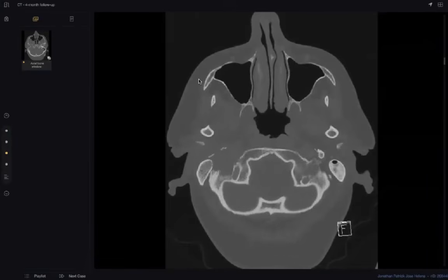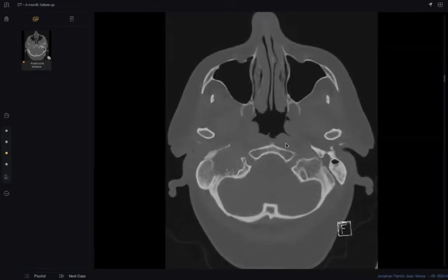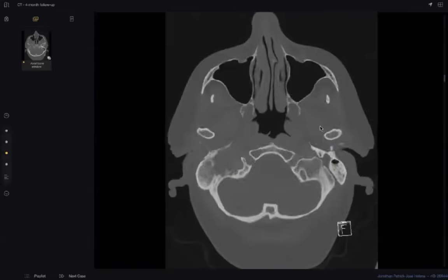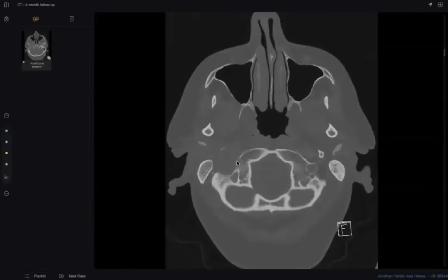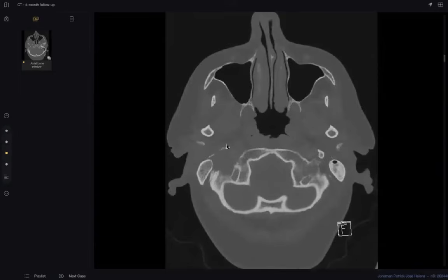And what is this? What is the name of this structure? This is the jugular foramen. No, the jugular is this one. I'm asking about more anterior, this one. There is erosion here. What is this? It's at a lower level, I think, so maybe the hypoglossal canal. I'm not sure. It's the occipital bone, anterior part.